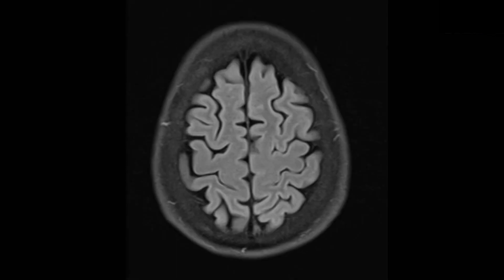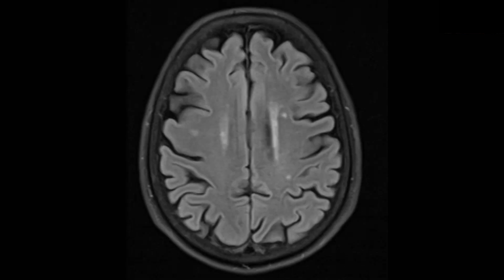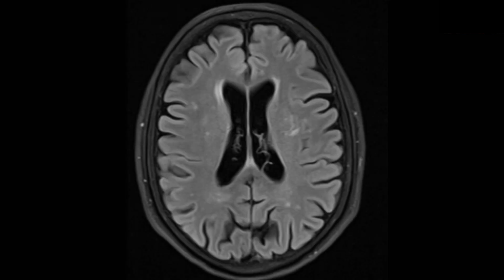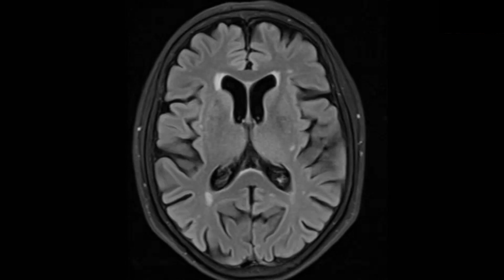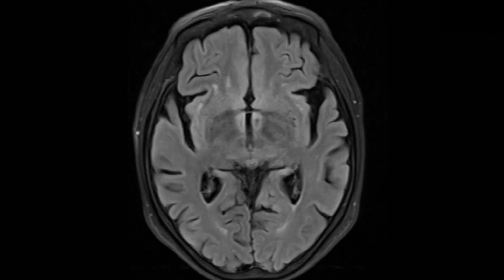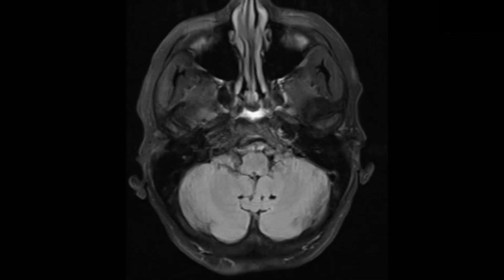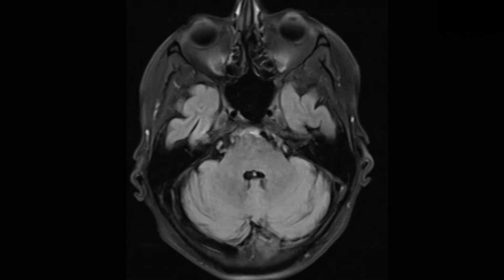Looking at the images from top to bottom, we observe moderate microangiopathic changes with corresponding signal enhancement in the FLAIR sequence. The ventricles appear to be a bit enlarged, whereas the outer border of the sulcus is still according to age in my view. Moving downwards, we also discover microangiopathic alterations in the region of the pons. The cerebellum appears to be normal.